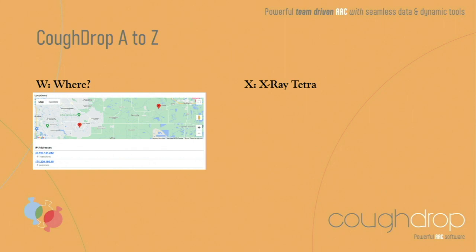So I can opt to track my data and not share my geotag location, or I can choose to show it. And something cool coming down the line with the where is hopefully, as we create more partnerships, if I have this on and I'm connected to Wi-Fi, it will know that I walked into a Chick-fil-A and it will prompt me if I want to pull up that board. So that's where that is in the software and why it's there and what our future plans are for that.